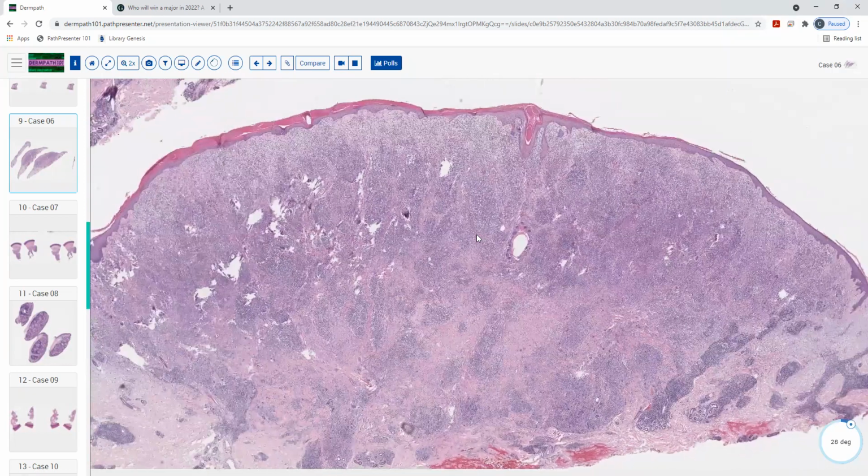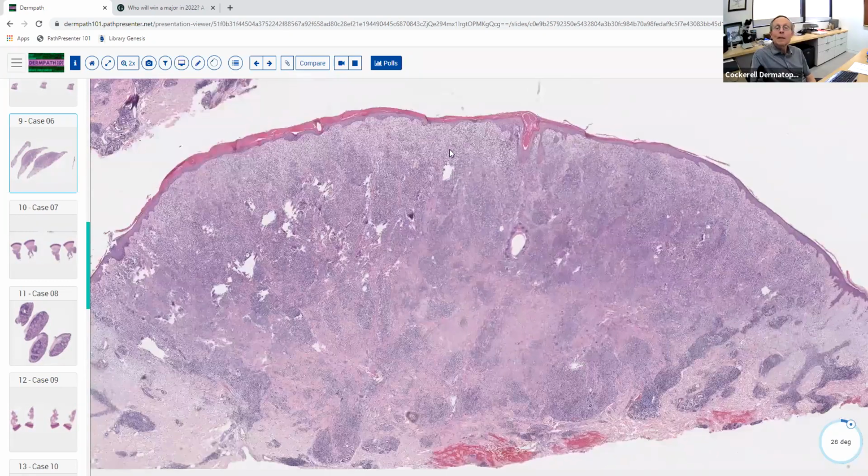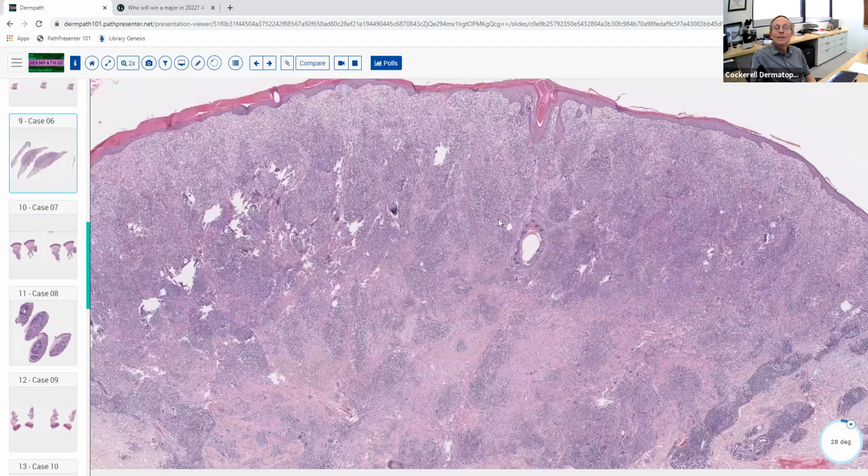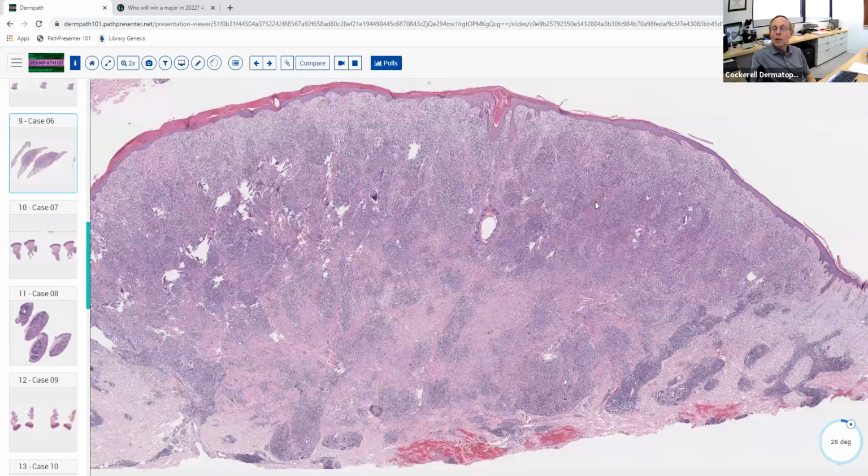Okay. So do you have any ideas at low power about differential diagnosis? I mean, obviously I looked at it earlier, so I have some ideas, but at this power, moving in now, you can see that there are these very tiny spaces that you can pick up. Like these spaces here, or you mean these spaces up here? Just throughout. This is a pretty good clue, though.